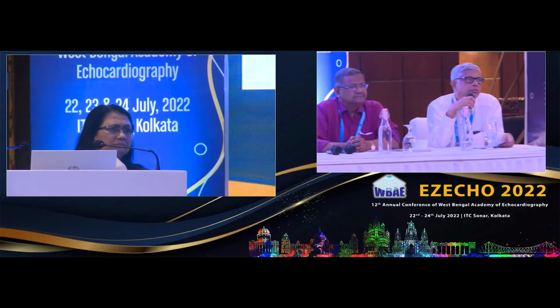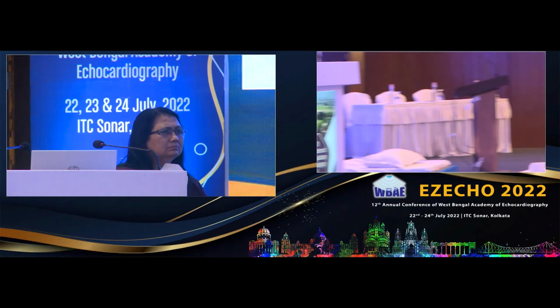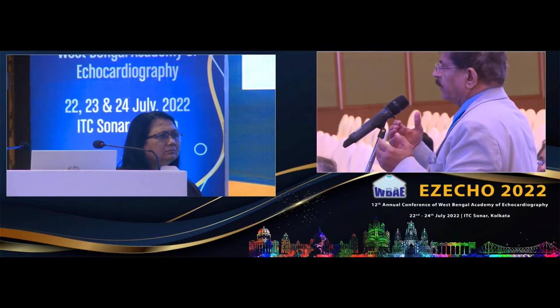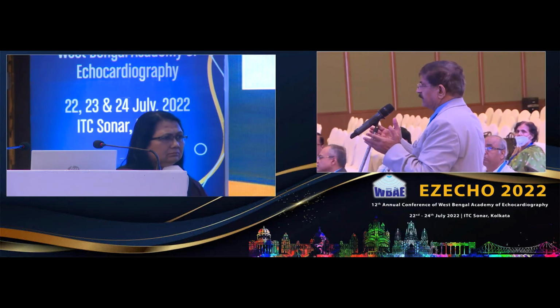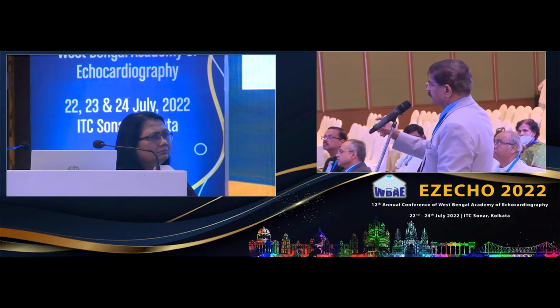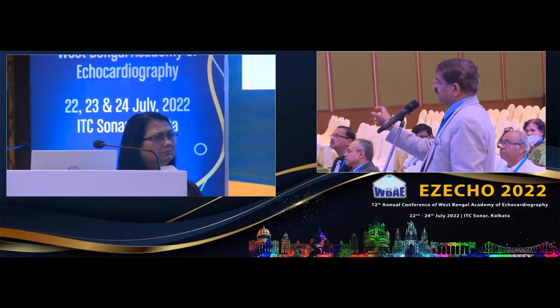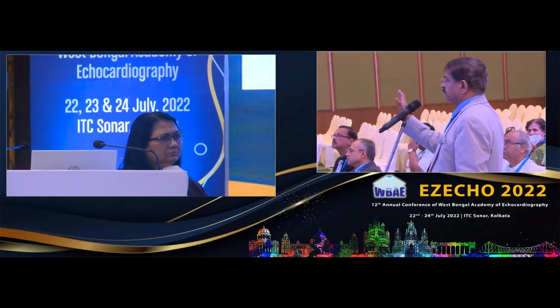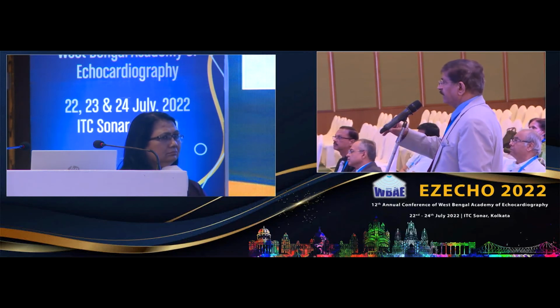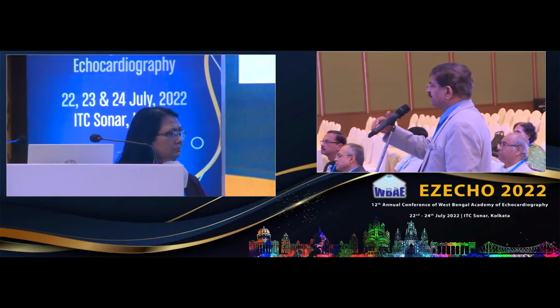The whole idea is that, as you said, whether it is spontaneous resolution or atheroembolism or a microcirculatory dysfunction, you can't decide actually based upon this picture. The point is it is not myocarditis because it's regional. It is confined to the LCX territory. That tells you that this is not myocarditis. And of course, there is a rise and fall of biomarkers, so it is non-obstructive coronary artery disease. So we have to treat according to the coronary artery disease regime.